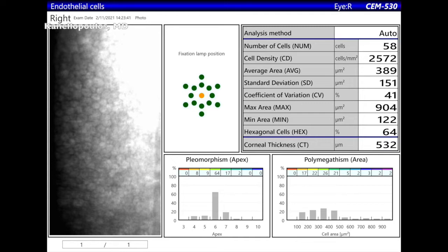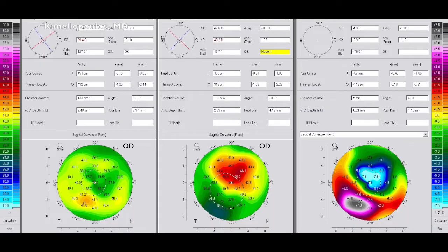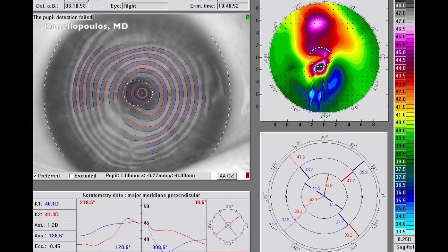We're going to go through our standard pre-cataract evaluations. This is the Scheimpflug pentacam map showing the significant flattening at the area of the herpetic scar and steepening across the field, and this is how the cornea changed through the years. We have a previous picture, and these are the 5mm refractive data from total corneal aberrations.